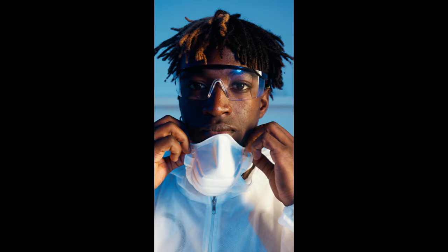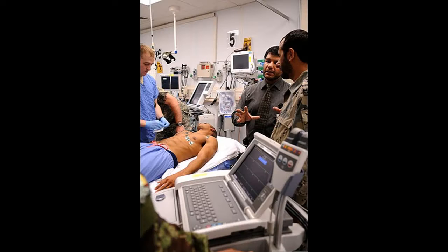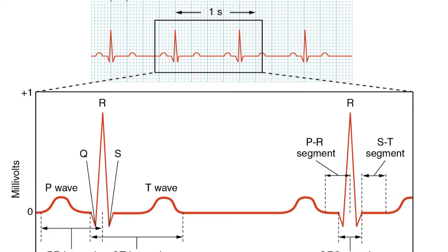Neil, I have a problem with the ECGs. Can you help me? Sure, if I can. What's up, Teresa? Dr. Sutton wants me to call him whenever a patient has a heart rate that's too slow or too fast. How can I tell the heart rate without a ruler and a calculator? Heart rate is easy to eyeball. Let me show you how.